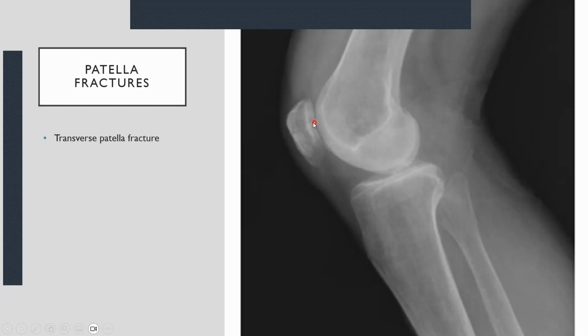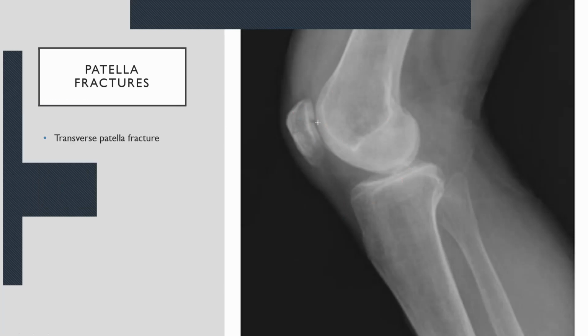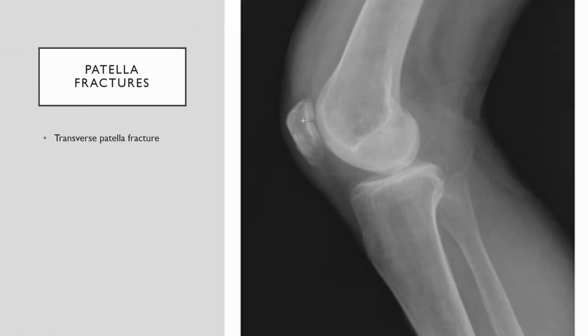If you look very carefully, let's try and draw it out here. Let's get a thin line going over there, maybe in red, and follow that. You can see that it goes there, and then we've got a little crack going up there, a little crack coming down here, a crack going across there, and possibly even two cracks running through there. So it's quite an extensive fracture. It may extend more, but I haven't checked my eyesight in a little while, so I could be missing some, but there's definitely a fracture going on over there. All right.